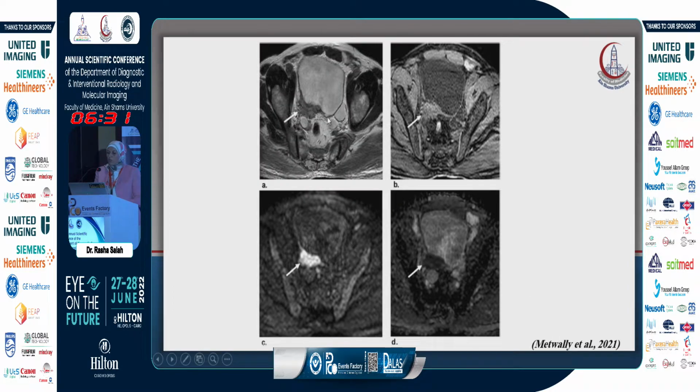This is an example where we can see a sizable extravesical component on T2 weighted image with the early enhancement of the lesion noted and the disruption of the early enhancement of the mucosa and submucosa, and this confirms the muscle invasive nature of this lesion. And this was correlated with the diffusion with the corresponding ADC map.